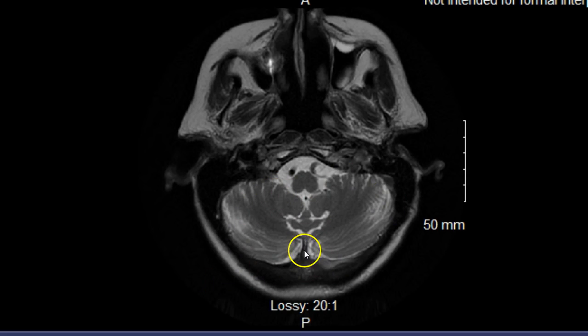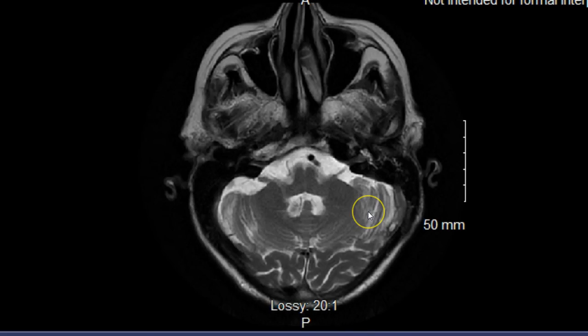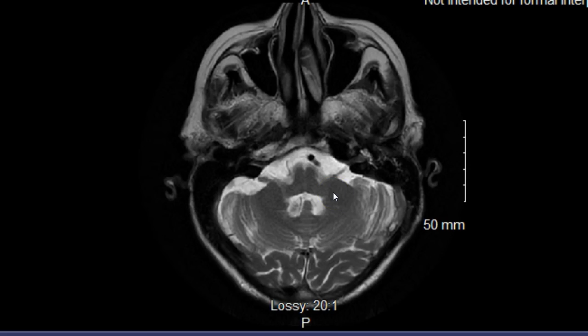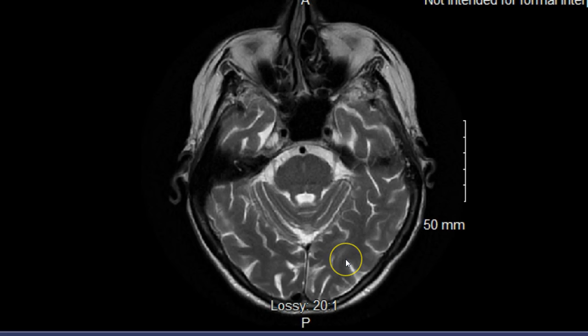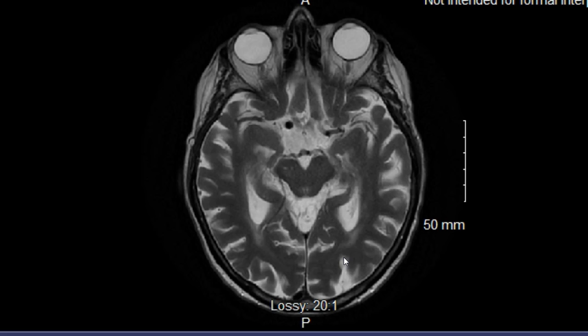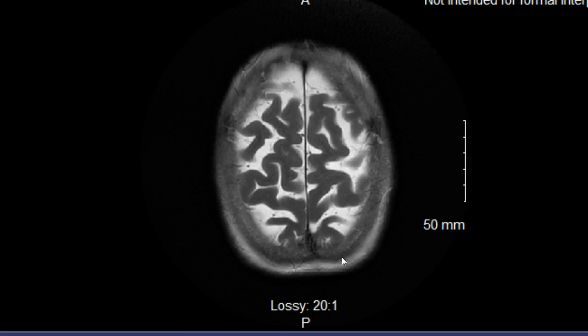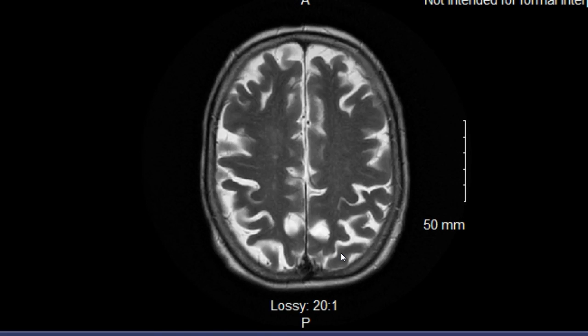Look how bright the cerebellum is in regards to how we can clearly observe the differences in the tissue structure between the cerebellum and the cerebrum based on the appearance of those sulci and the gyruses that are associated with that tissue there. So just generally a different appearance, different orientations.